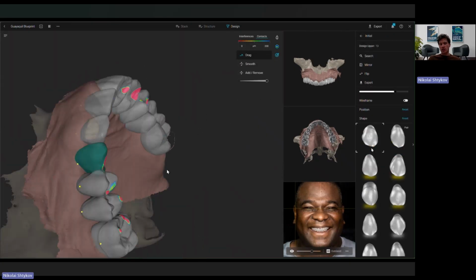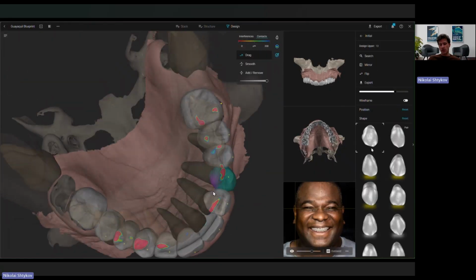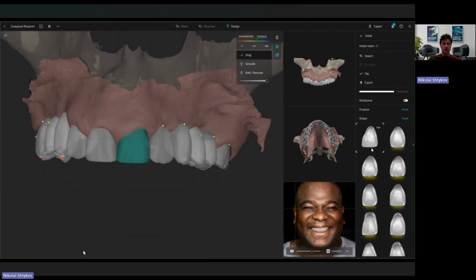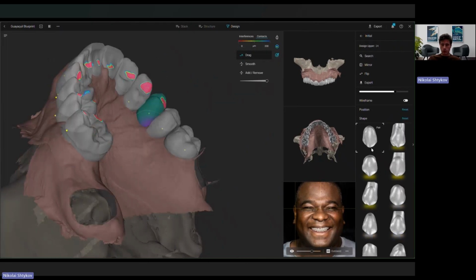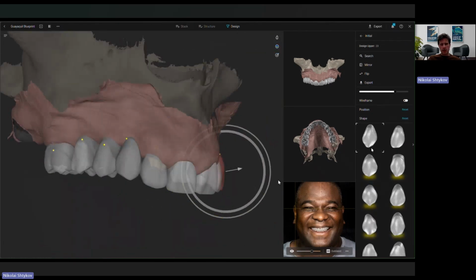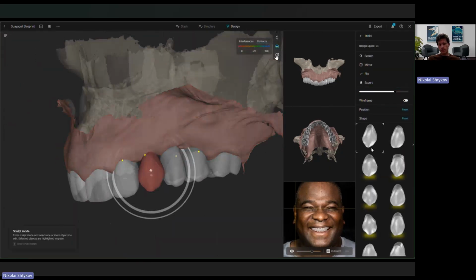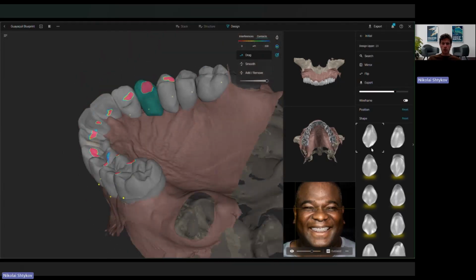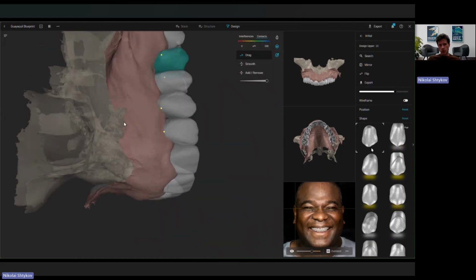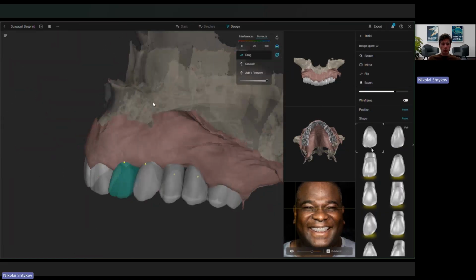We also can check in Smilecloud the bite position, super contacts, and change the position of the teeth a little bit, and that's what I'm doing here. You can see this design as I did before, the sped-up version of this. So I check the canine design also, check the size, making the final editing, and it's almost ready to review. To add volume here also. And I think it is almost done.